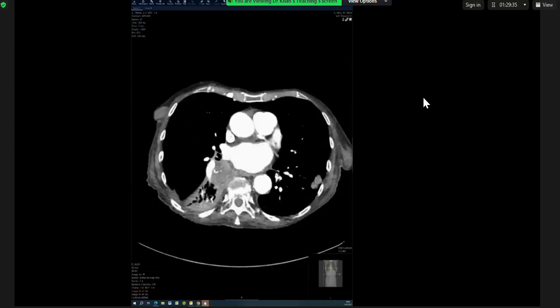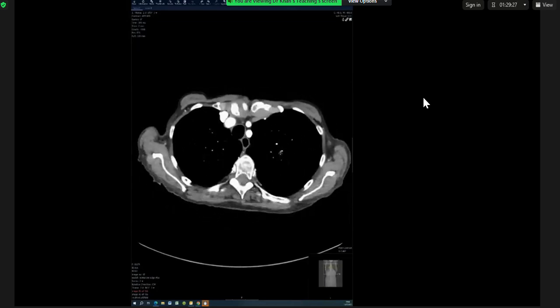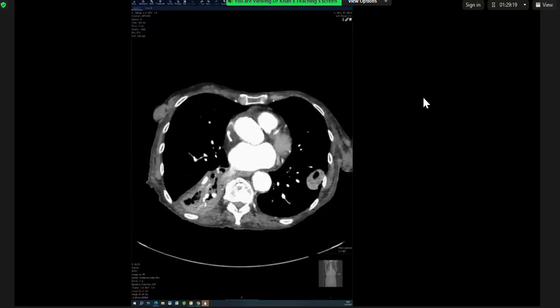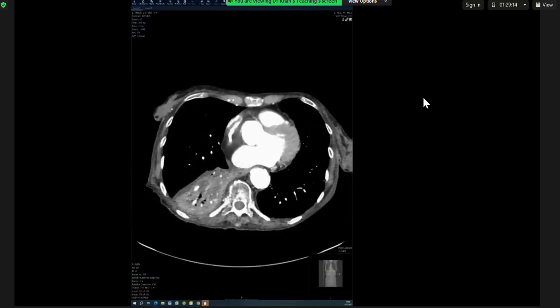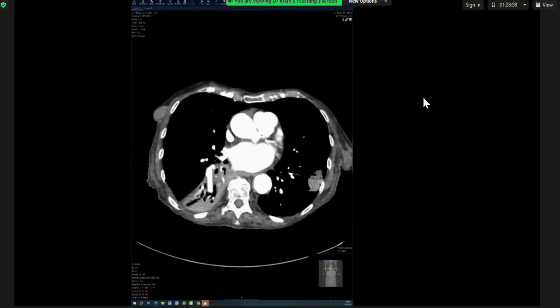Okay. Yeah, thank you. Once you call that a primary, you then have to say nodes. For central lung masses, you have to look at the SVC because those are your urgent life-threatening findings. Lung cancer, you have to look for the Brownie points: the incidental PE, the SVC obstruction, intracardiac metastases. Those are the ones that will get you the maximum marks. Because once you're on a CT like that, picking an abnormality isn't exceptional. It's getting all the things right, and there will always be little things on the case that will take you that extra mile to get you full marks.